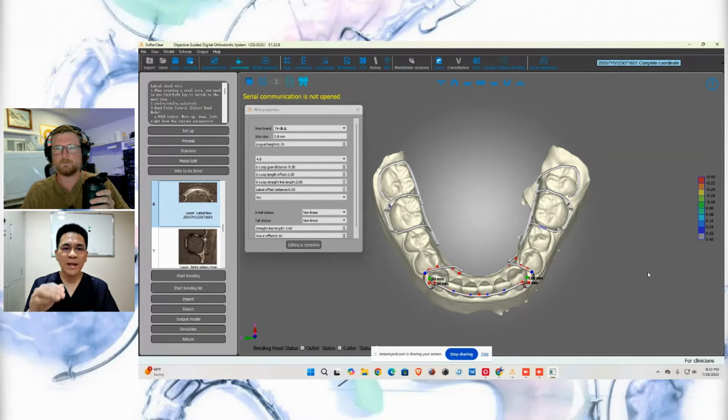Right. So I think they can upload the models and what they want to bend, and the ODC will design the wires. When finished, you can get the wires, and you need to download and calculate them. Then you can bend directly. You don't need to design.